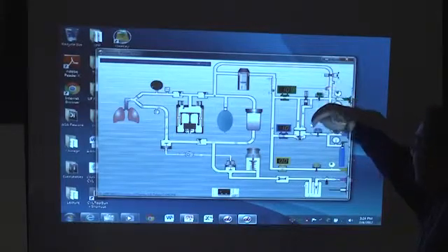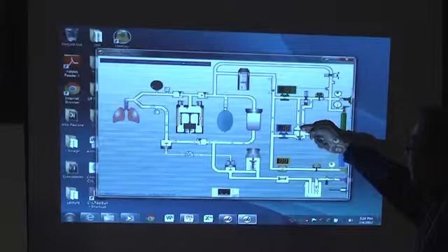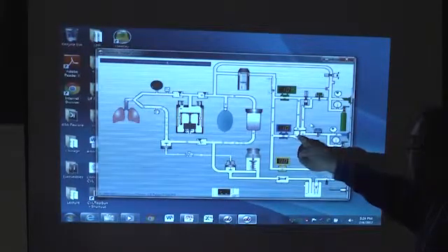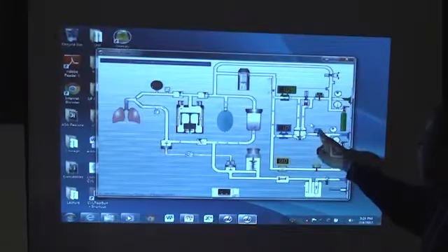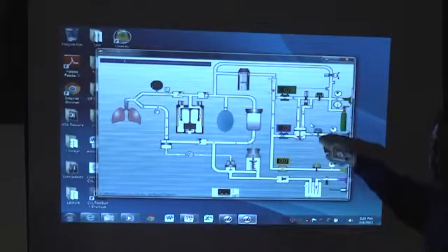So if there's enough flow of oxygen, the pressure of the oxygen hitting the diaphragm counteracts the spring and creates a flow passage for the nitrous to flow. The nitrous is really being controlled from here. That's how you set this, it's just a mechanical needle valve.